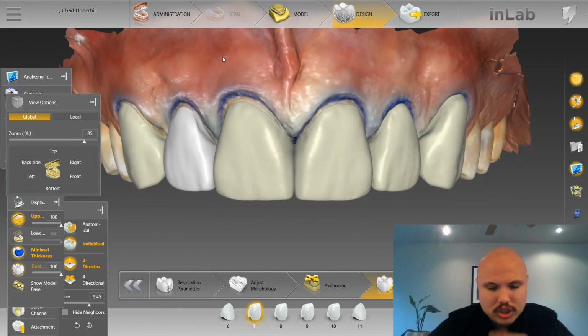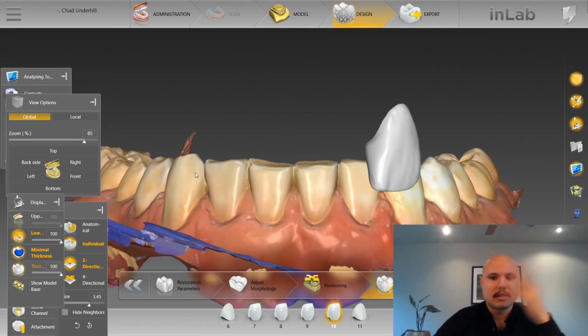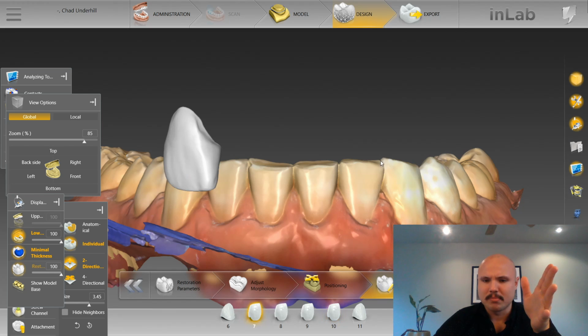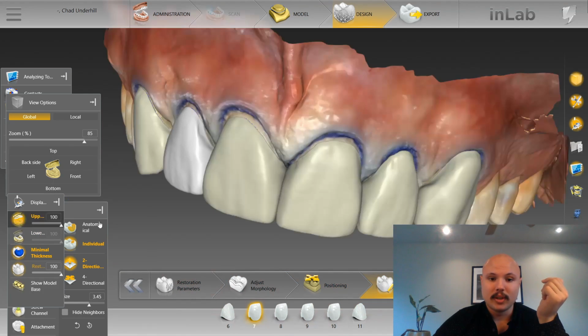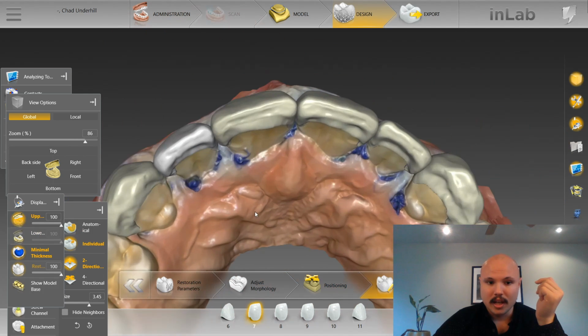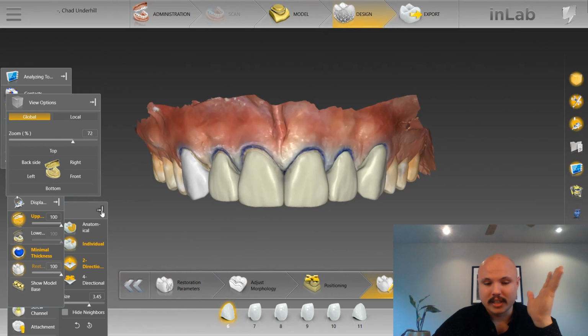One thing about this shape that I like to adjust manually are, one, the cuspids. I think that they're too sharp. But if you look at the lower cuspids, they've got that same kind of appearance, like a flatter facial surface, and they've got a sharper edge to them. Typically, you're going to see this on cuspids because they're worn down. And if you look at the shape of these cuspids, they are worn down at the incisal tip. So that's kind of why you've got that sharp appearance.